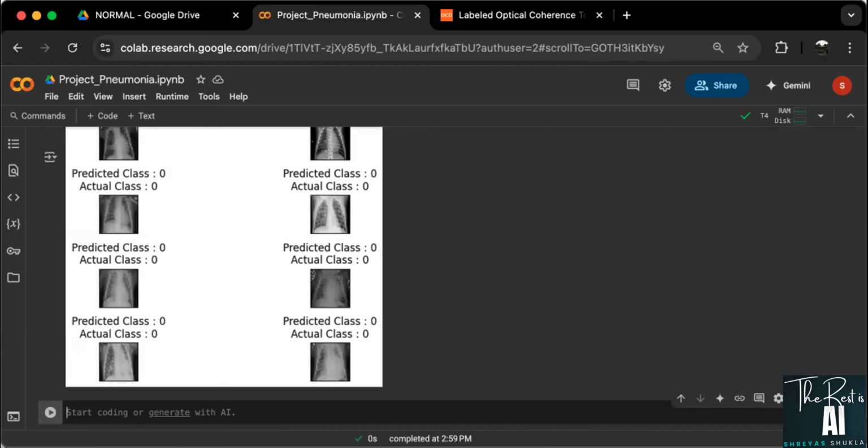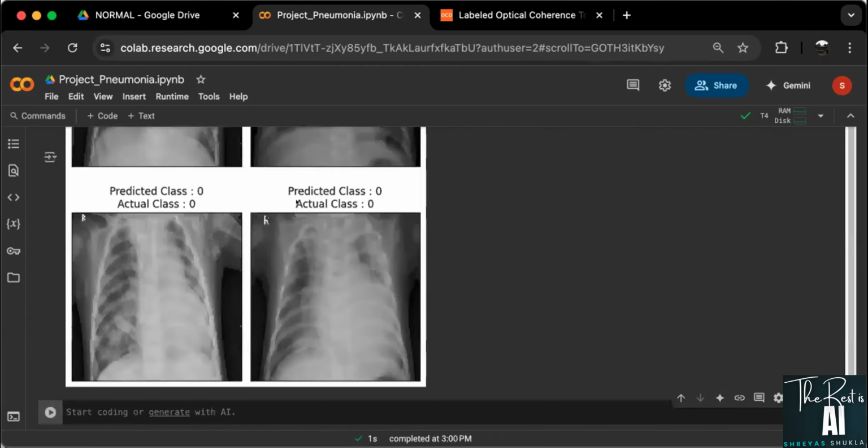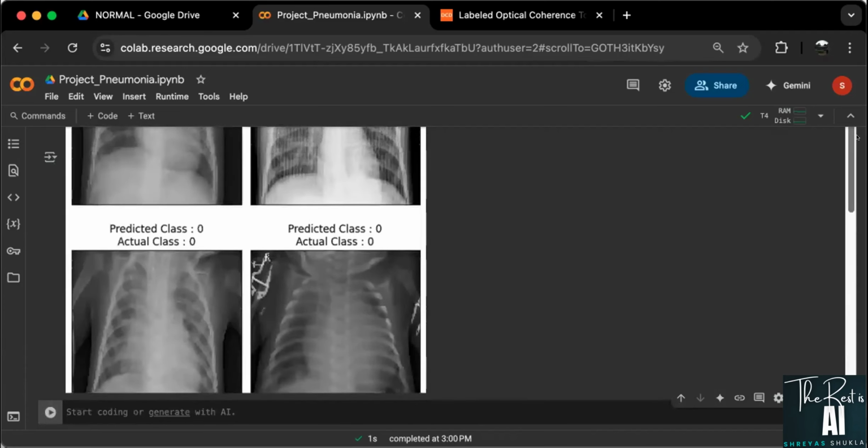Not good again. Well, let us try to do one more time. So it is giving me a reshaped value, but it is not doing enough of a good job, but maybe what I'll do is I'll put this as 6 by 15, if this can work. Yeah, now this is good. Alright, so there we go.